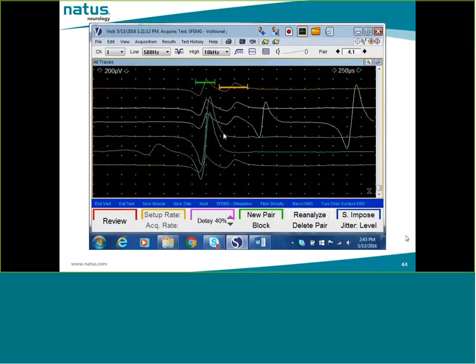Notice that these signals contain only one action potential. There is no second time-locked action potential on these traces. This mimics blocking. Because these potentials are generated by a different motor unit, we call these technical blocks. Let us see how the software can handle technical blocks in this recording.